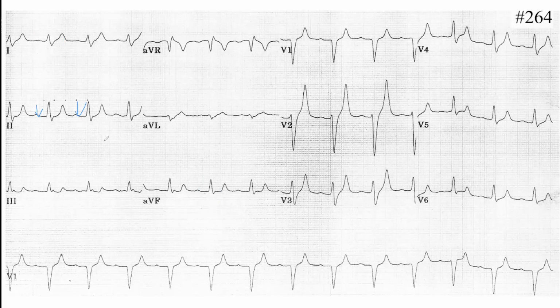That's a part of the diagnosis as well, because flattening of the P, elongation of the P. I meant the positive P in 1, 2, 3. Okay, good. Go on. After every P, we have QRS. PR looks elongated, and now Q wave. I don't see any Q wave.